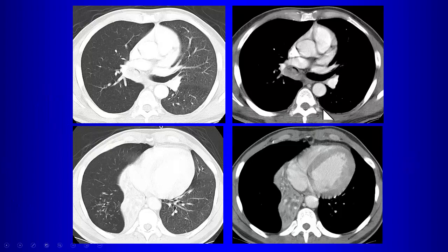And here's the bronchus intermedius. There we have an obstruction there in the bronchus intermedius. Here's the collapsed right middle lobe. Here's the collapsed right lower lobe. Of course, these things are blood vessels. What are these darker things? What are these things?